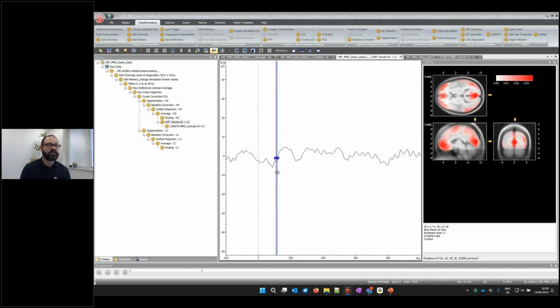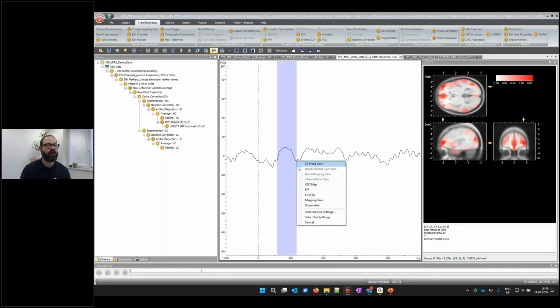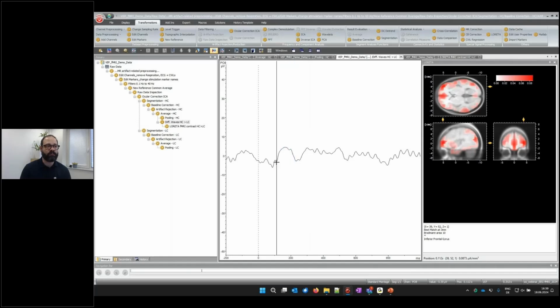So you can, of course, do this here in a data point by data point fashion, but you can also do the transient view based on a longer time window, getting the whole peak. However, you see now that you get a little bit of diminished blobs here, because now you use an average across this whole time window, from 116 to 234 milliseconds. So again, this is a little bit like averaging out some extreme values, and not that much will stay. So I would actually say it makes sense to look into this voxel of Brodmann area 17.